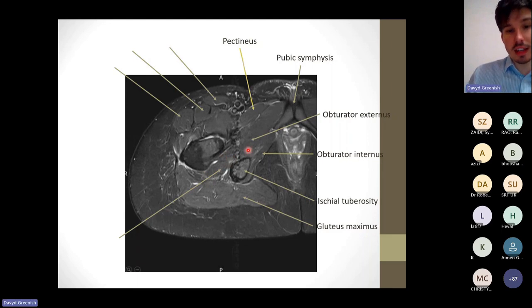There's another muscle here, which you can't quite see snaking through, between the ischial tuberosity and coming around towards the femur, which is one of the harder muscles again. This is the quadratus femoris muscle. Again, that's a really tough one. Pectineus is tough, and quadratus femoris, those are tough muscles. Then coming around anteriorly, we've got a few more muscles here. Some of these have quite characteristic appearances. If we go from left to right, people just want to chuck out any of these muscles, starting with 1, 2, and 3.